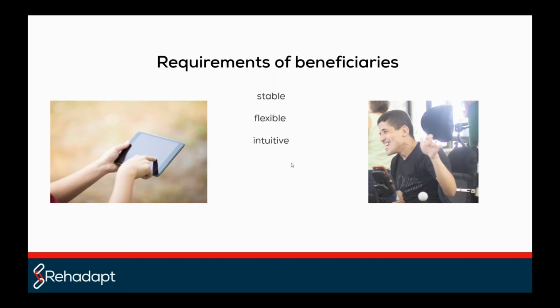And when you see an inserting element on a wheelchair, you can insert it within a second. And it needs to be very universal. When you're having a second wheelchair and you want to use your tablet system on the other wheelchair, often you only need a different base or elements like the base coupler, where you can use the same arm, maybe also on another wheelchair, if it is possible. It always depends a little bit on the system. And for that point, it should be and can be very economic.